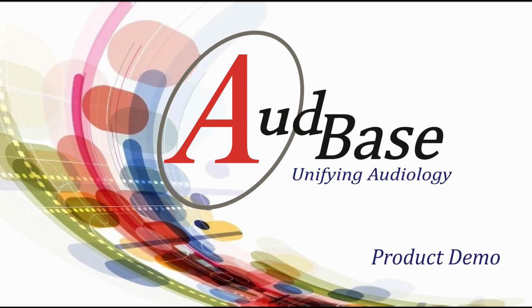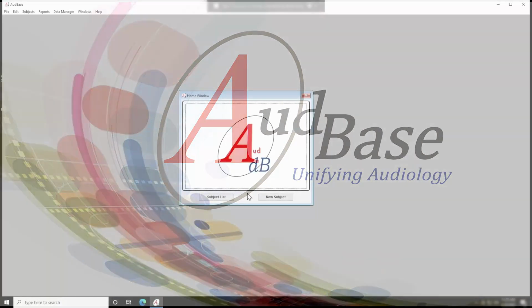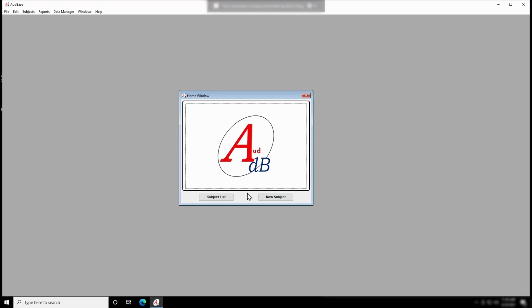The purpose of this demo is to show a brief overview of some of the features and the operation of AudBase. AudBase can easily be integrated with your EMR to create an efficient and streamlined workflow. Even if you don't have an EMR, you can still benefit from AudBase with its easy electronic capture of data from audiometric equipment and storage of records to a central server.